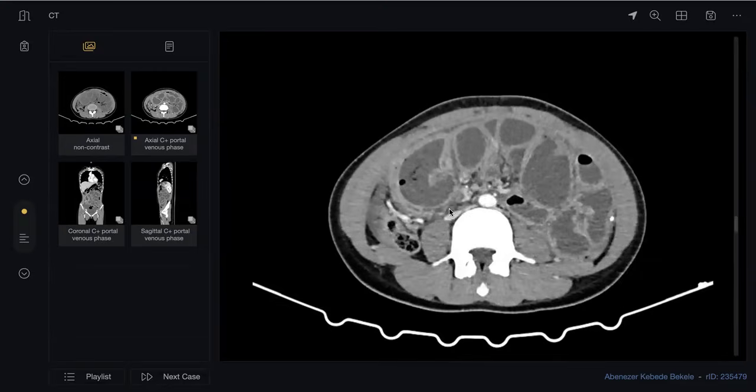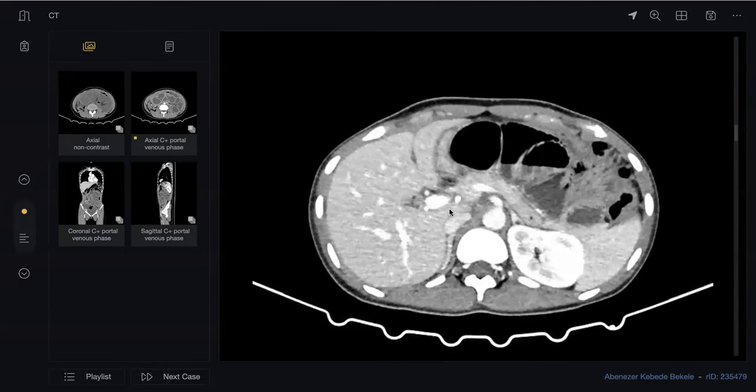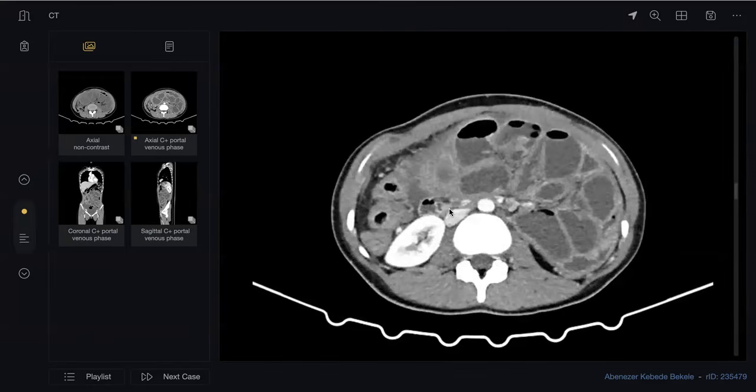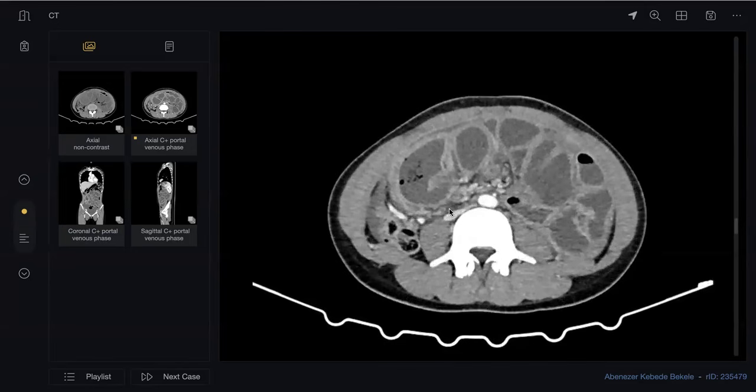Peritoneal sclerosing mesenteritis or sclerosing, something like that. Encapsulating peritoneal sclerosis, in which there are clustered, encapsulated, fixed, dilated small bowel loops radiating from the center of the abdomen, and there are loculated ascites and peritoneal calcifications. What is the most common cause of encapsulating peritoneal sclerosis or cocoon formation?